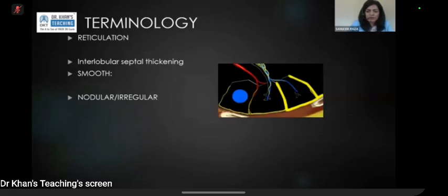Fissures are also pleura, so that line, that reticulation, can not only sit here, linear, next to the chest wall, it can also sit next to a fissure as well. So that's also subpleural. So subpleural reticulation just means thin, short lines sitting in the very periphery of the lung, most commonly at the lung base.